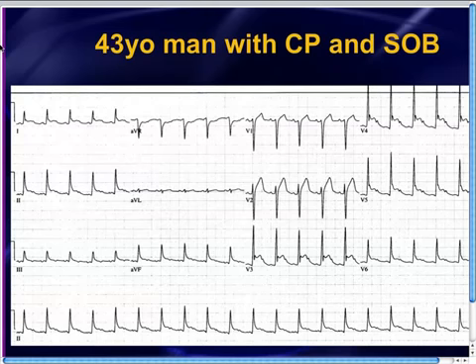If you look at the rhythm down there in lead 2 at the bottom rhythm strip, what you might be noticing is that there's these little extra blips, and we established last week that blips is the technical term for these little extra beats that you see in here. And in fact, in multiple other leads, take a look at lead V3. You've got those blips in there as well, and up in lead 4 and in lead 5. And as we mentioned in previous weeks, whenever you see extra blips or extra stuff, that's the other technical term, extra stuff in the rhythm, you've always got to wonder, are those extra P waves?